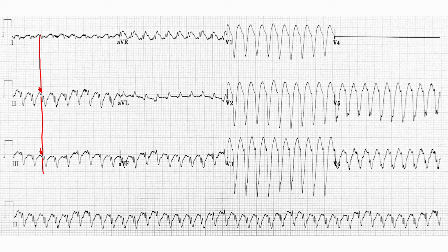How could a single VT mechanism be exiting from the right ventricle and from the left ventricle? It's almost impossible. So overall, VT is eliminated, and the diagnosis is SVT, because SVTs very commonly can have left and right bundle branch block aberrancy.